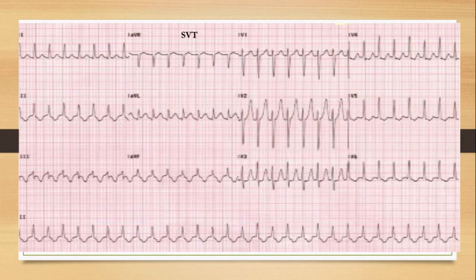So that was as far as the ischemia and infarction were concerned. Now let's look at the supraventricular tachycardia. So this is just a normal, nice rhythm. You can see every P wave is followed by QRS, and there's just a very fast heart rate. There is no other problem. There is no ST segment depression or elevation or any other problem. T waves are a little bit hyperacute, but they are tall, but it doesn't mean any injury at all.